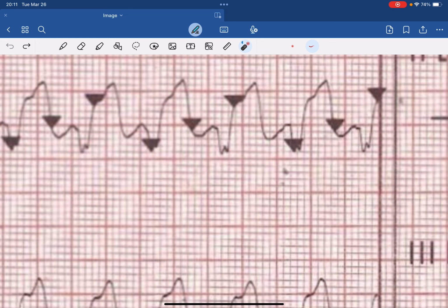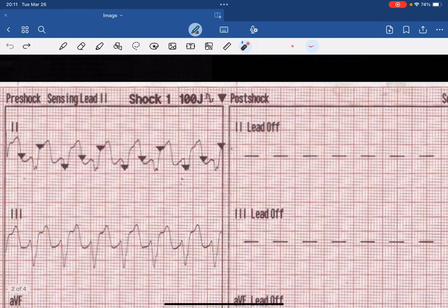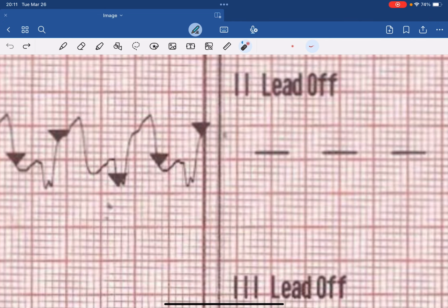And as you probably have remembered me saying on numerous occasions, you can always tell a T wave by the way the wave kind of veers off to one direction like this. And you can see that veering beginning right at that J point. Now, if we move down a little bit further down the strip, we'll see that one of the sync spikes is syncing right on that T wave.